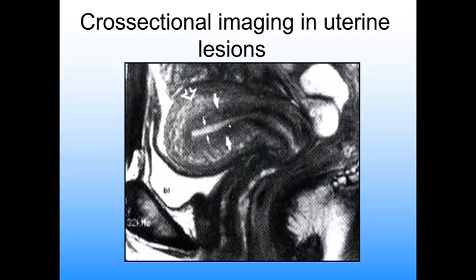First, the endometrium. The endometrium is hyperintense signal on T2. As I told you before in the first part of the lecture, the zonal anatomy is better delineated on T2 weighted image. How can we know the T2 weighted image? By the fluid signal in the urinary bladder and in the vertebral canal, and so this is T2. In T2 weighted spin echo signal, we can see the endometrium much better. The endometrium is hyperintense on T2.